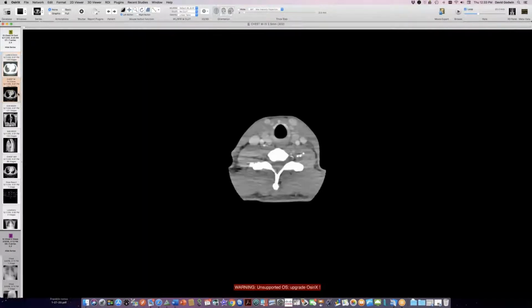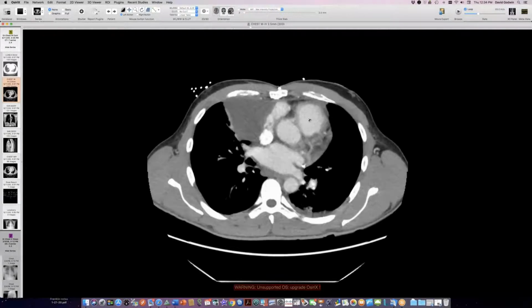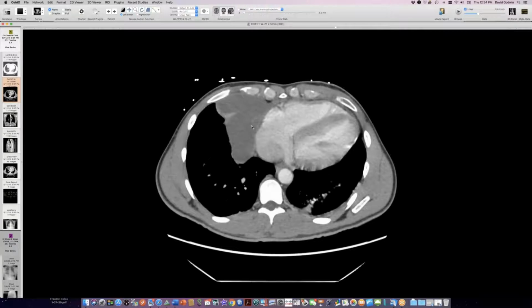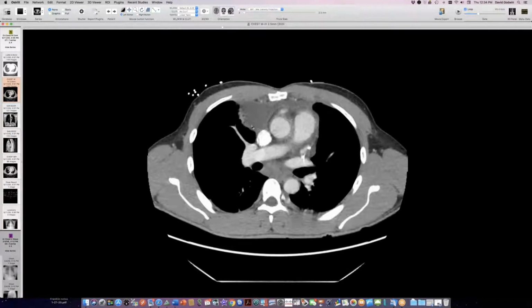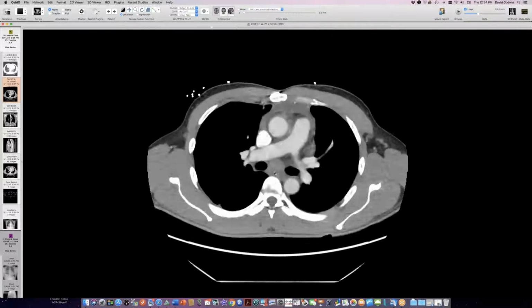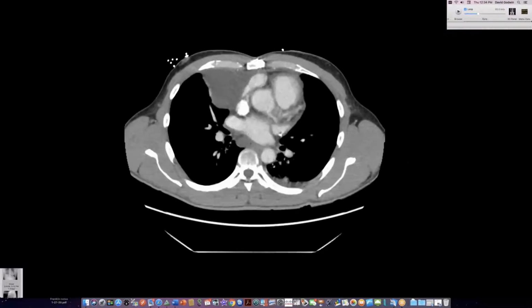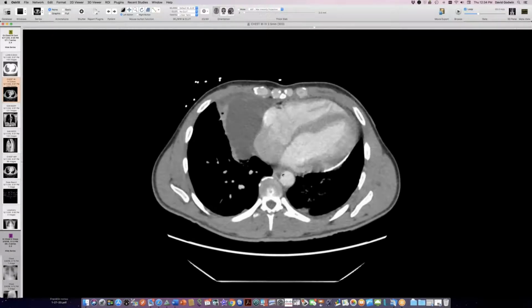This was re-CT'd, and we seem to have recurrence of anterior mediastinal low attenuation material, and then this big component over here in that right cardiophrenic angle. But it's all contiguous with this anterior mediastinal tissue. And there's also stuff back here now in the more posterior parts of the mediastinum. There's sort of similar lowish attenuation homogeneous stuff.